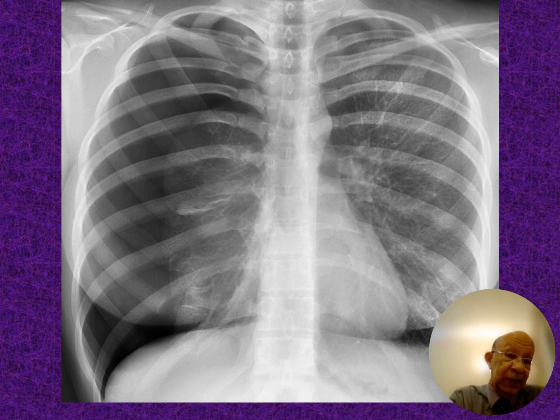Now another difference, you're supposed to have that of different blackness in the lungs.